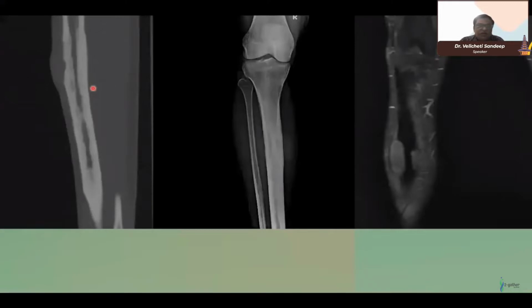And in the same picture, the medulla is also not looking that healthy. There is some medullary sclerosis, soft tissue swelling, surface lesions, an osteosarcoma type of appearance, surface juxtacortical or periosteal osteosarcoma. That is our leading possibility.